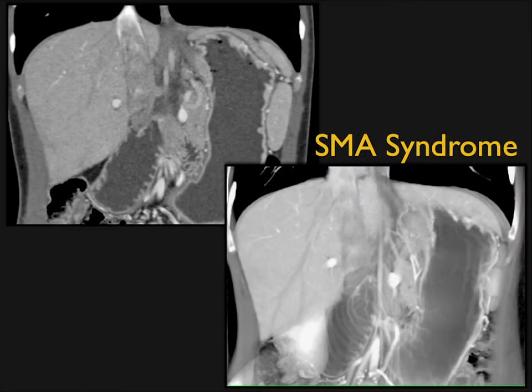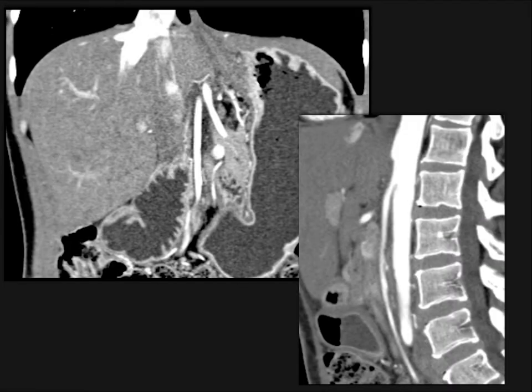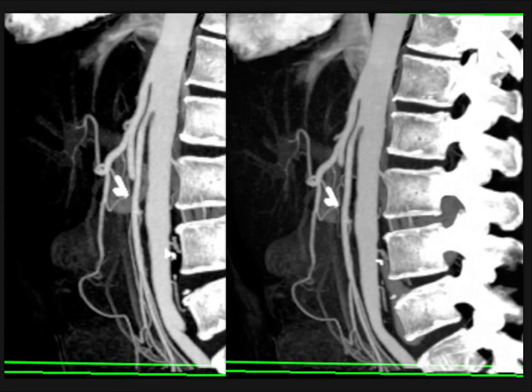Another example. Here's a patient, distended stomach. Again, often it's gastric outlet obstruction symptoms because it sort of is gastric outlet, but it's more than the outlet. And you follow it here downward, distended bowel. And then you follow it some more, and you see the distended bowel transitions at the SMA. You see from the sagittal view, which is the critical view, the decreased angle between the aorta and the SMA, and you know you're dealing with SMA syndrome.